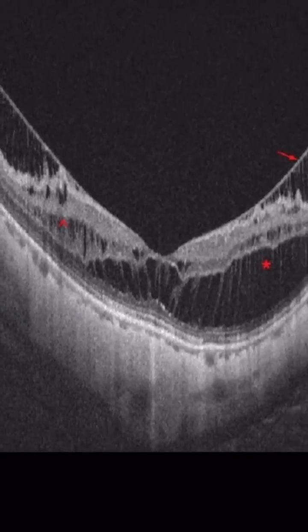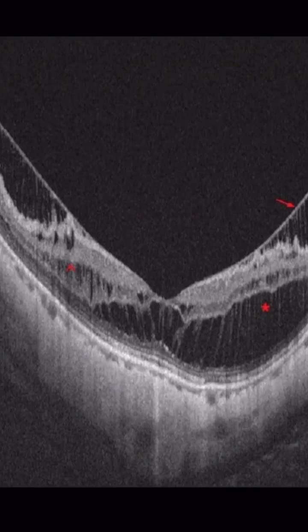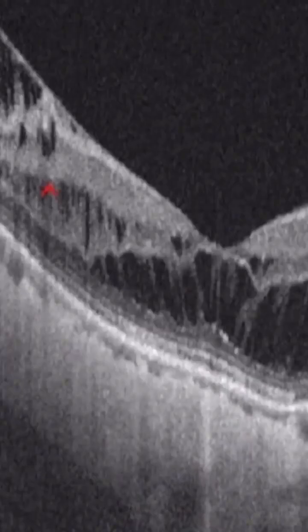By the way, the shape of the retina here is a posterior staphyloma, right? The eye is bulging, bulging backward, right? So in those patients with high myopia, the choroid is extremely thin. We call that leptochoroid, by the way, a term that actually nobody uses today. But this is what happens in those patients. So we have the RPE, a very thin choroid, and then after that, the sclera.